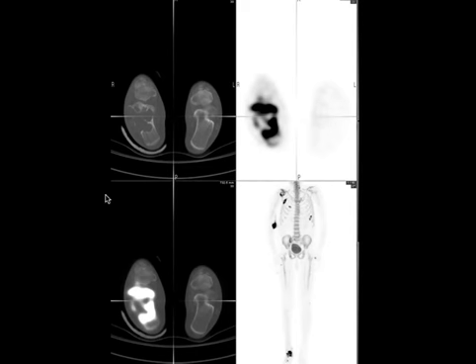These images are showing the right calcaneus on the CT bone windows, the PET image, the fused PET-CT image, and the whole body image. There is a large lytic lesion involving the right calcaneus, which shows peripheral intense uptake. Now, as I said earlier, renal cell cancer produces osteolytic bone metastases, and that's what it is. But even at the periphery of these lytic lesions, there is a lot of osteoblastic activity, and that osteoblastic activity will take up the tracer, which is seen here. So a very rare case of lytic bone metastases to the calcaneus from a renal cell cancer.